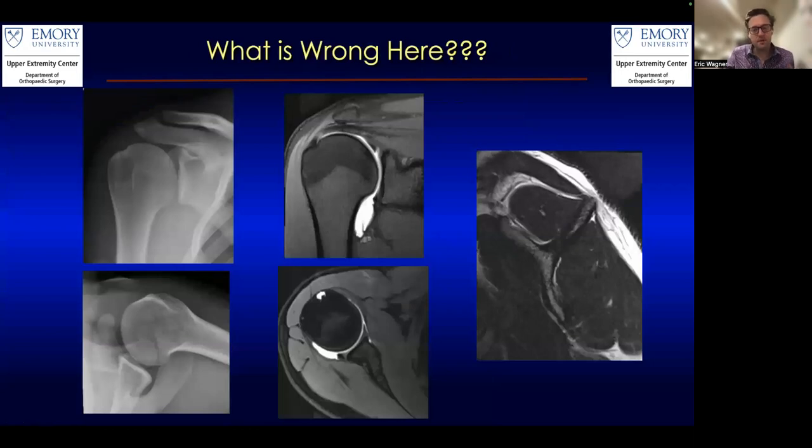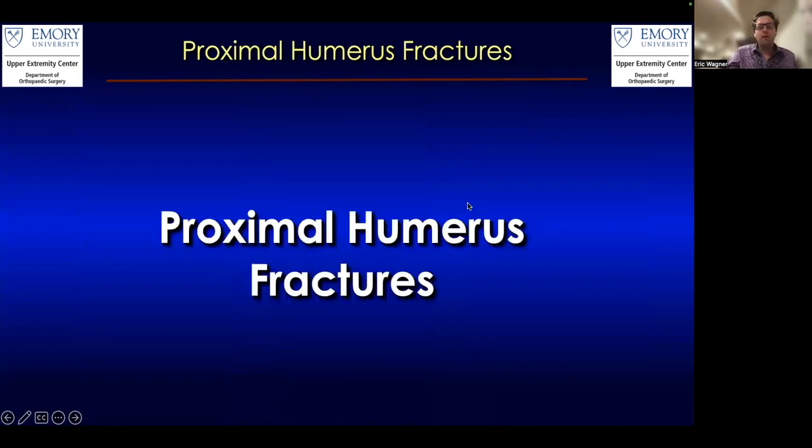So you can see here, in general, the patient's looks pretty well centered, pretty well centralized here, pretty good muscle here. But you can see once again, remember that Hill-Sachs lesion. You can see a pretty dramatic inferior capsule there.